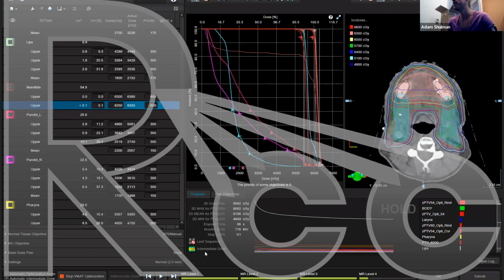And so it's not robust. That's the biggest thing about optimizing to the skin: it's not robust. The reason is you're optimizing right to the skin surface. You've got air right next to it. You've got no scatter, no buildup, nothing like that. It's all tangential, with no in-scatter. And so you have a lot of fluence in order to get that 100 to 105 range. Now, when you shift your ISO, or if the patient moves a few millimeters, and now you're treating into the skin, you've got your buildup, your in-scatter and your back scatter. It all of a sudden jumps to 120 to 130 hotspots.